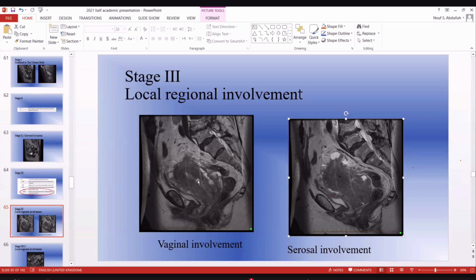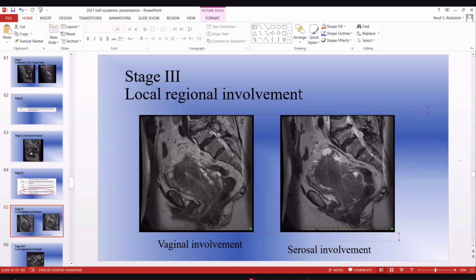So in this case, if I'm not sure, like if I think that this is primary cervical, I would stage it based on the cervix, and I would refer the patient for biopsy. Keep in mind, I always say that, but sometimes the patients come to us before. I always say, if the patient is a gynae malignancy case, it's better to get pathology first before getting the MRI, because the pathology will help me to identify what's the primary.